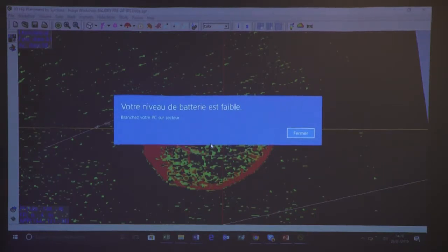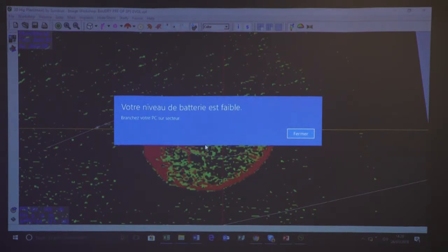It will tend to increase the femoral anteversion. Sometimes I will just try to remove this bone with the curette. It's quite rare, but you know, we are looking for the outliers, the 5% of patients that will create 95% of complications, you know. Do you have any question about this, I would say, simple case? A 3D planning for a simple case takes between 5 and 10 minutes. Not much more than, I would say, a digital templating.